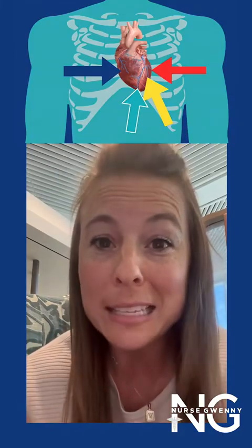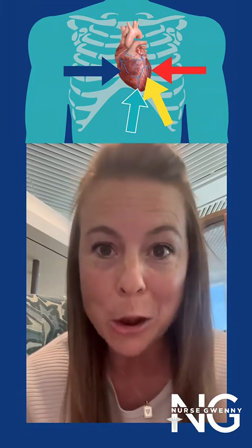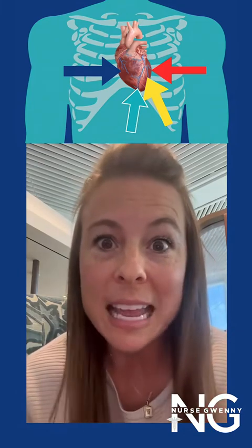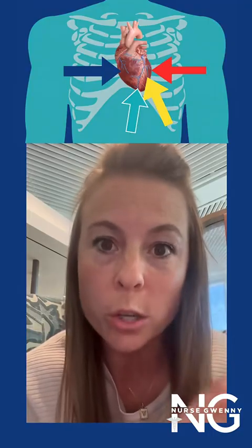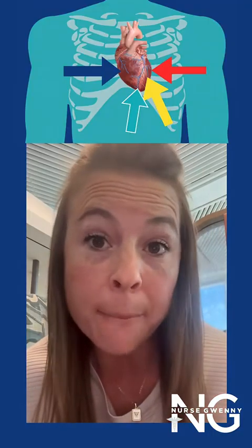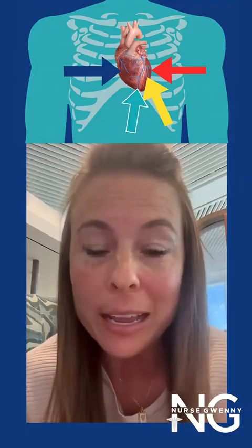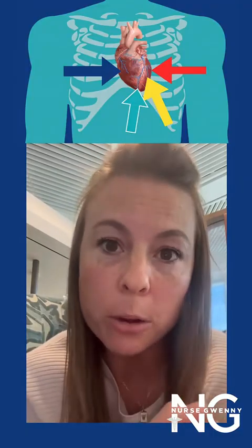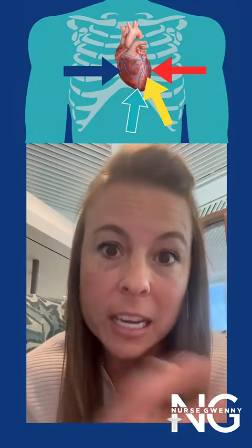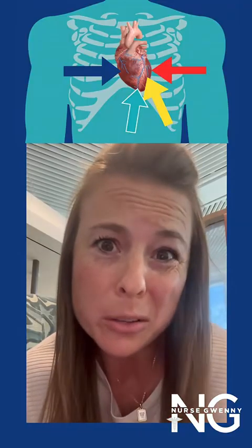There are reasons we need to know this. Let's say the patient is having an inferior MI. We know that the RCA is the affected vessel, and that's what feeds our patient's SA node. So that's why these patients having an inferior MI are going to be bradycardic: if that SA node is starved, it's not going to be generating the beat for the heart. It's going to be generated elsewhere in the heart.